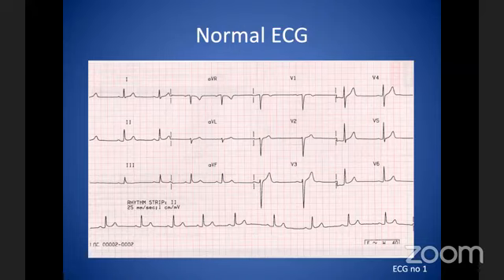Thank you. So what we're going to do on this ECG, it says on the top it's normal ECG. So no points for telling me it's normal. We are going to go through a sequence of how we should approach an ECG, even if we don't know what's wrong with it. So I want you guys to one by one tell me what are the things that you should be looking at or trying to report on whenever you're asked to look at an ECG. So any one of you can just unmute and mention one thing, then let someone else mention the other. For example, heart rate. I'm just giving you an idea. So go on then. Just tell me first what you guys have in your mind.